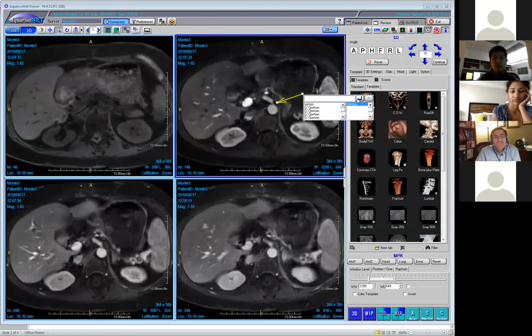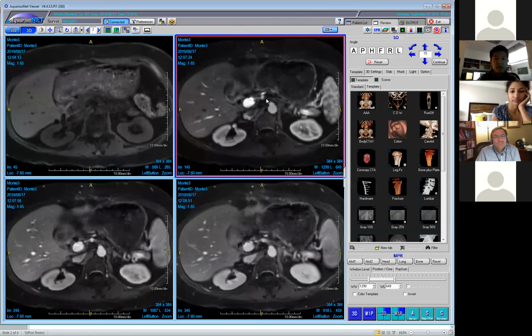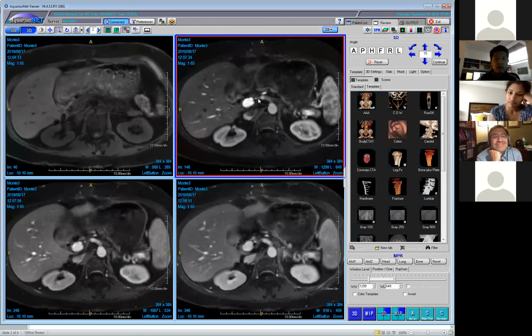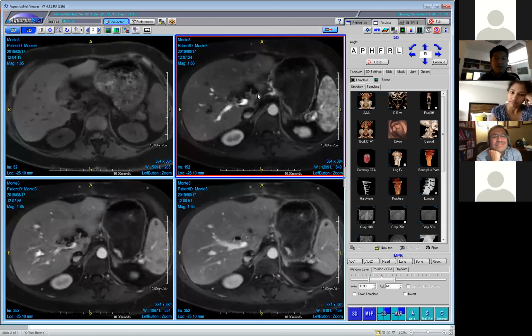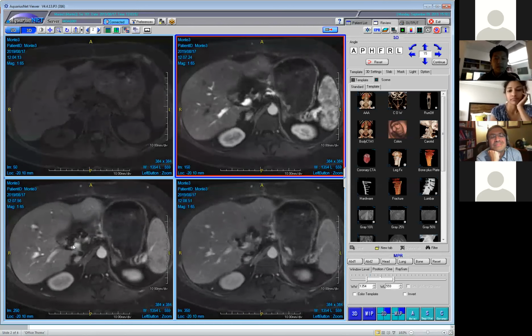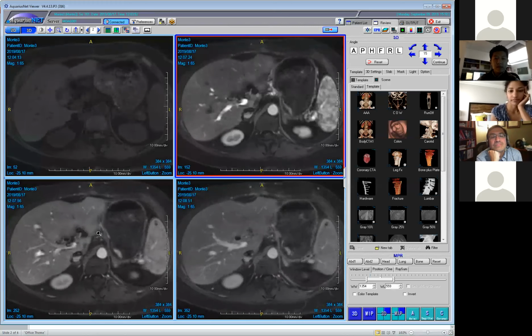I noticed that the celiac is markedly narrowed, right? As I was following the artery, you can see that it's kind of like narrowed, then maybe a little bit dilated, then sort of we lose it maybe because of the artifacts. Distally, the branches are opacified.